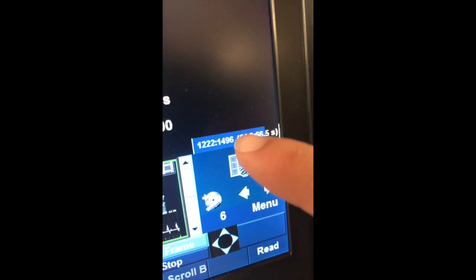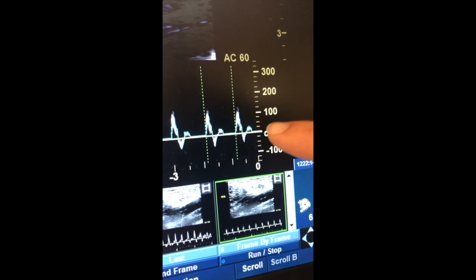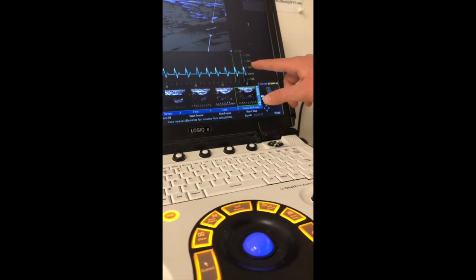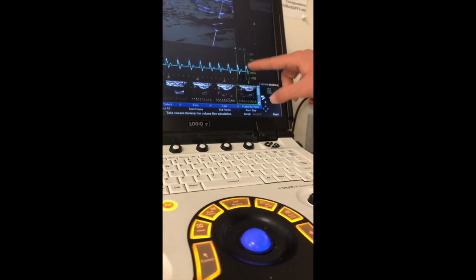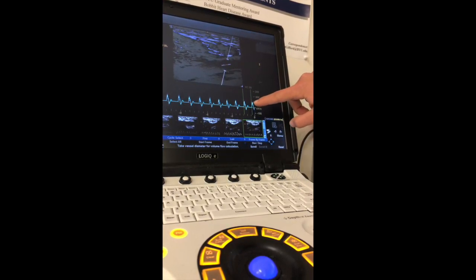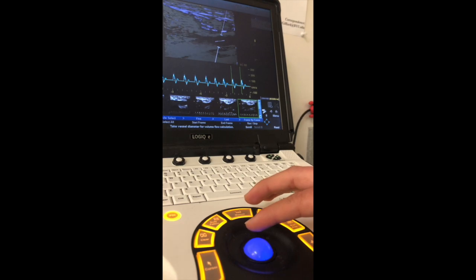And now that I'm close to 54, as you can see there, I'm just trying to find where this peak is covered. The nearest peak is covered by the black. So basically whatever picture is on the screen is where this bar is. It's kind of a bad description, but wherever this bar is going to be the picture I'm seeing. I want to make sure that I'm just before any peak, because that will give me the picture that's the most accurate for the diastolic blood pressure.